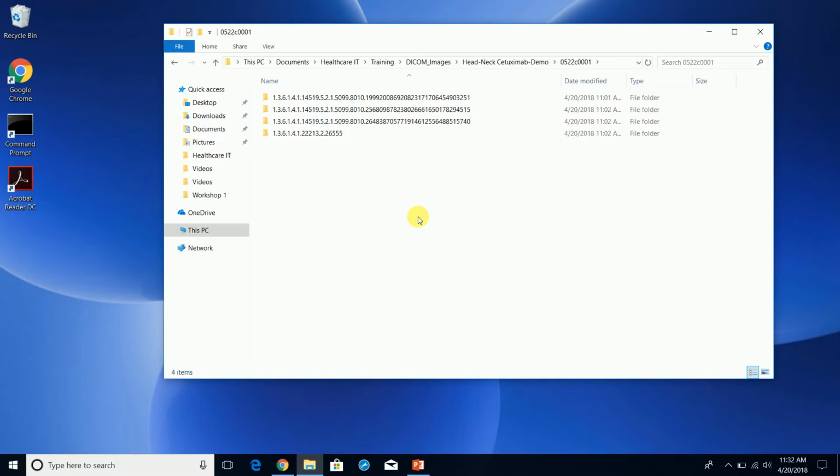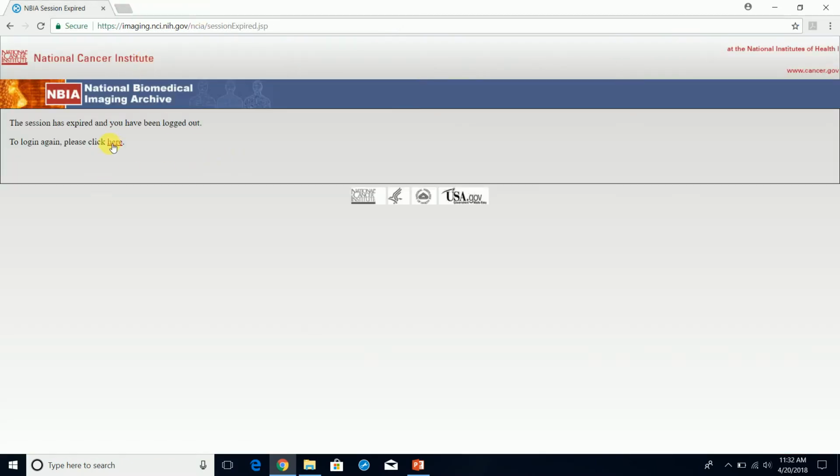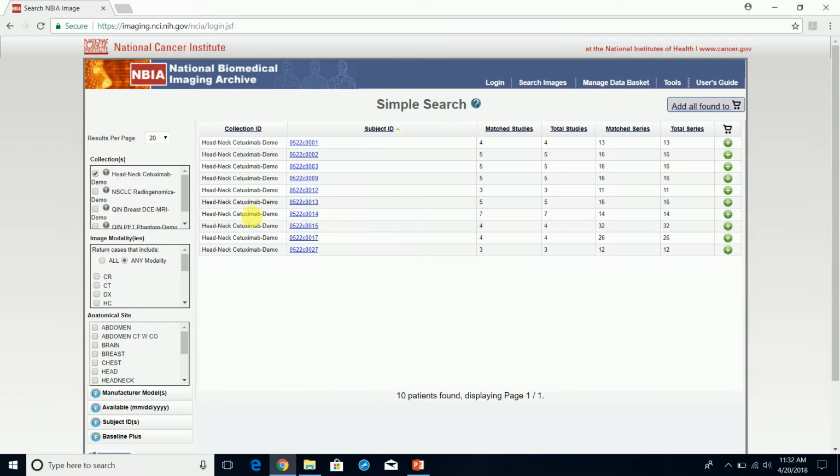One thing that I wanted to point out real quick from the last video that I did is that I want to make a slight correction. When we did the search, let's see. So the slight correction, I missed this here.